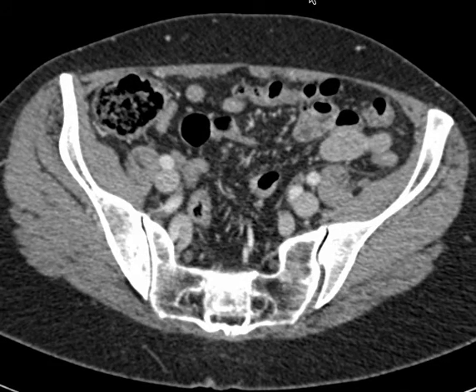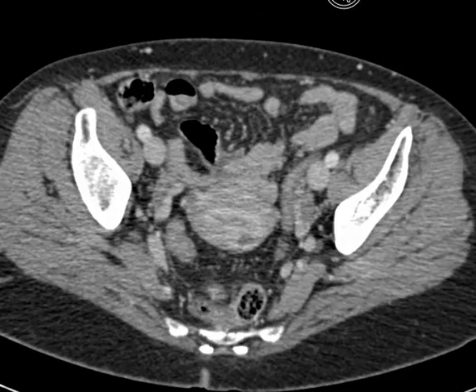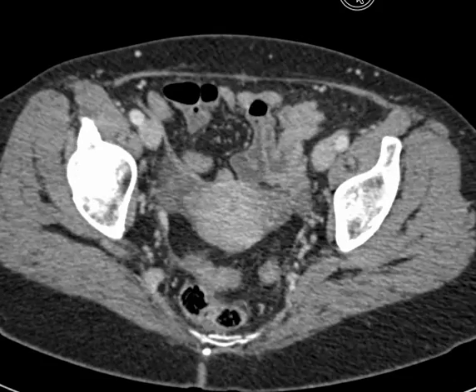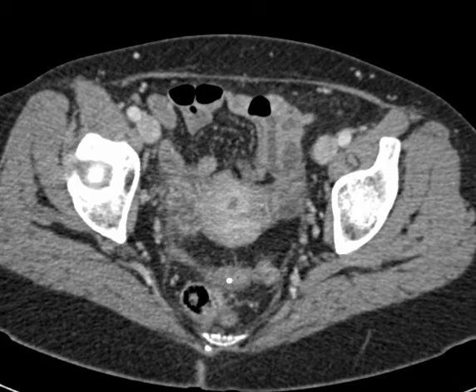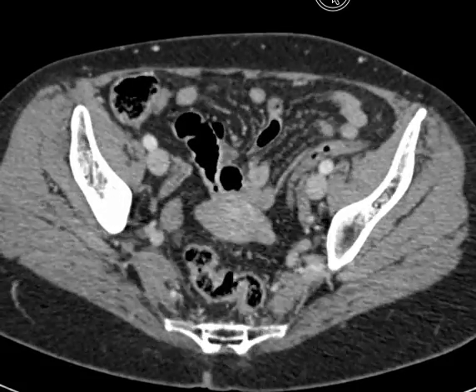There's the descending colon. Now into the sigmoid colon right here. So right as it reaches back into that left lower quadrant, you'll see the sigmoid heading right down this way. For reference, this is the uterus here. Now we have sigmoid colon. The sigmoid is going to end in the rectum.